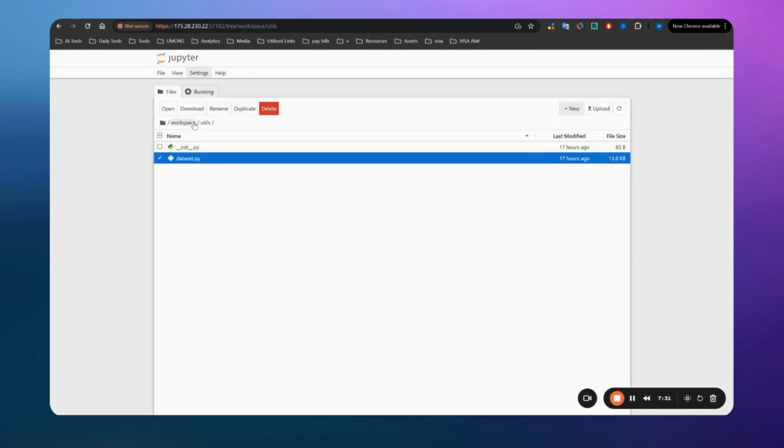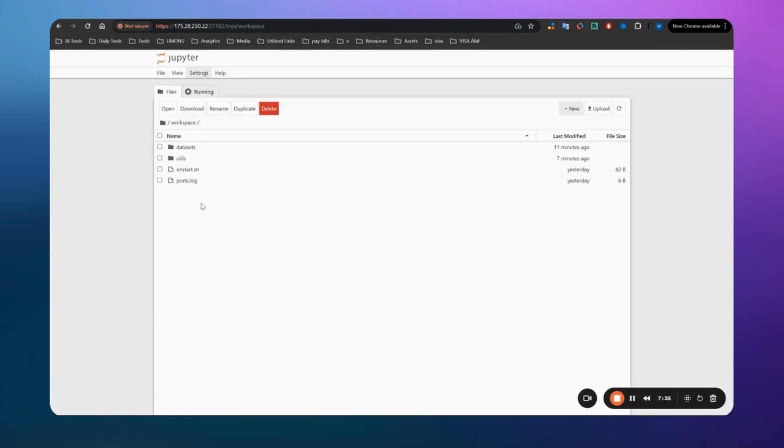So I will just continue, because doing the splitting and the renaming will not require libraries that are not installed by default with Python. For example, we have os and glob, so you don't need to care about this. So let's try to work. If there is any issue, we can think of something else. As I said, I am just running the code with you, so if any issue happens, we will try to figure out how to solve it together.